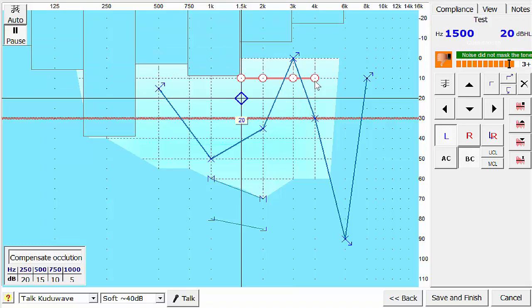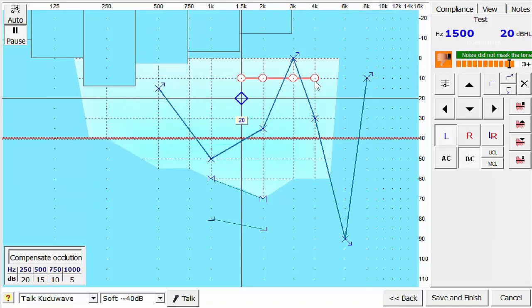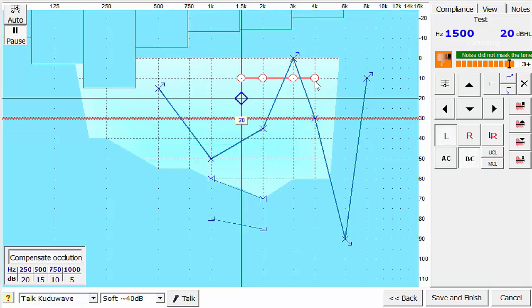Now, if I've done masking, I might still want to add a few more dBs or decrease the dBs of the threshold. So you're still in manual control. The automatic masking just starts where you most likely are going to mask.